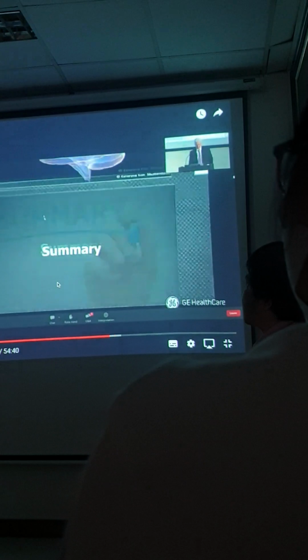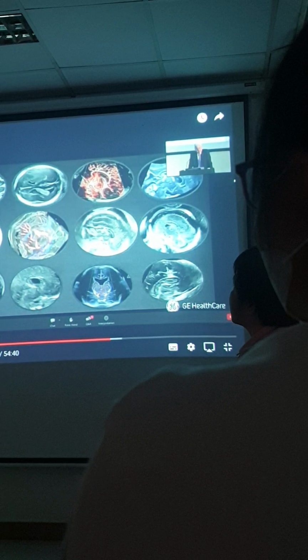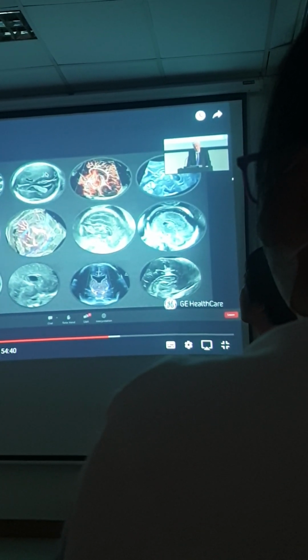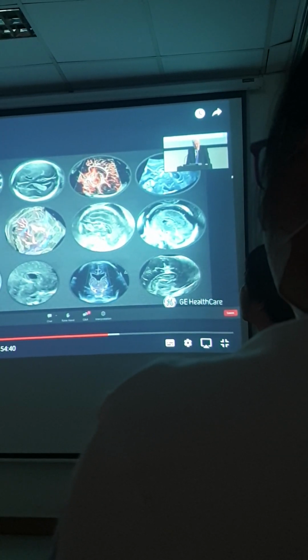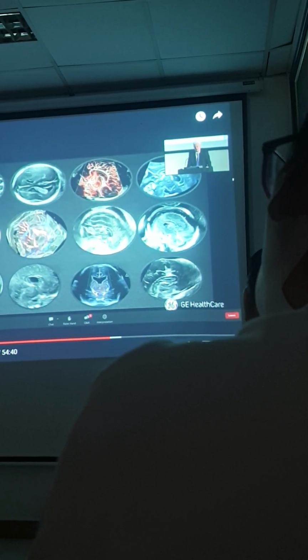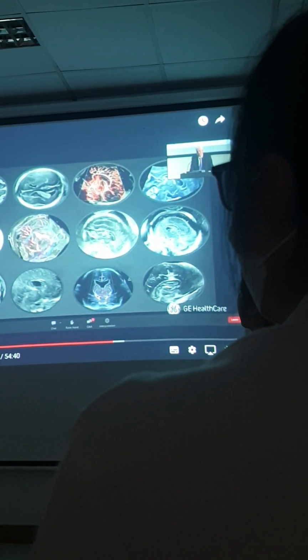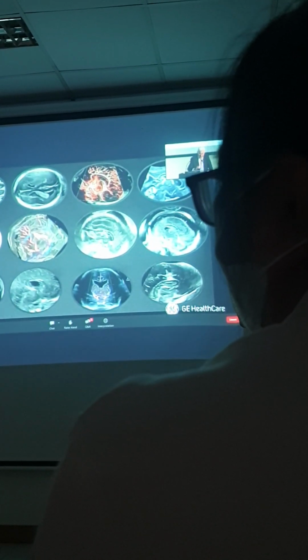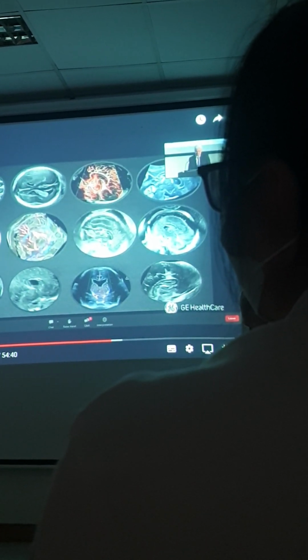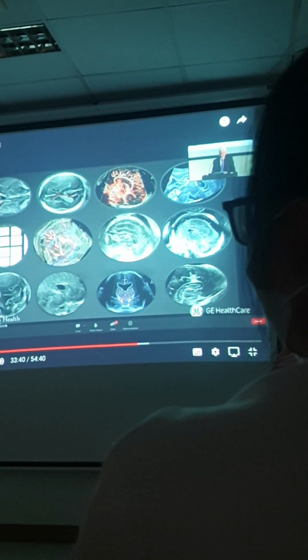So in summary, what I present to you today is you do the three sections that ISUOG recommend: transventricular, transthalamic, and transcerebellar. For the brain, it's the transventricular and the transcerebellar that provide most information. The transthalamic tends not to provide much assessment, other than the situation where you're suspecting ACC and you're looking for third ventricular dilatation. What I say to you is go well beyond that. Look and see where the anterior horns come in and converge toward the midline in every scan that you do in the mid-trimester. Secondly, become familiar with the curvatures that exist in the medial wall of the lateral ventricle.